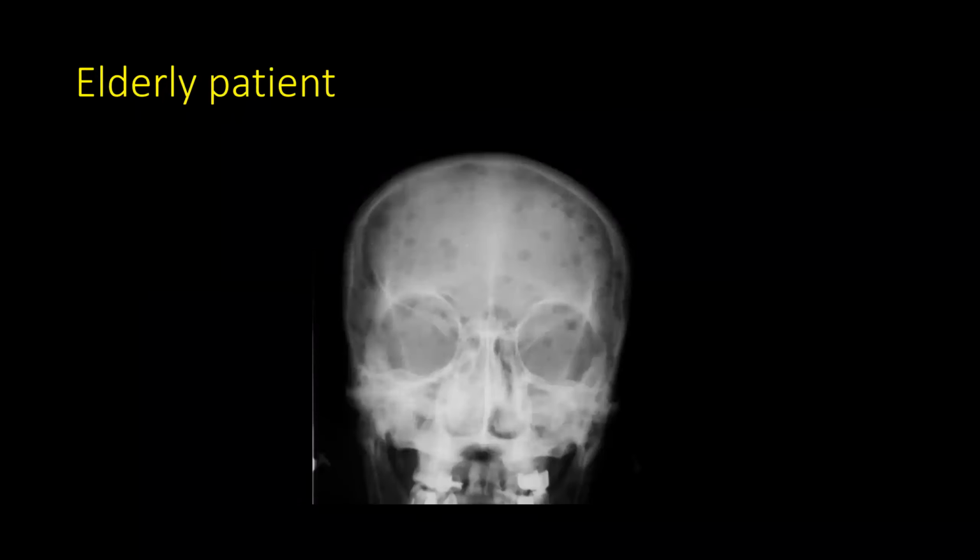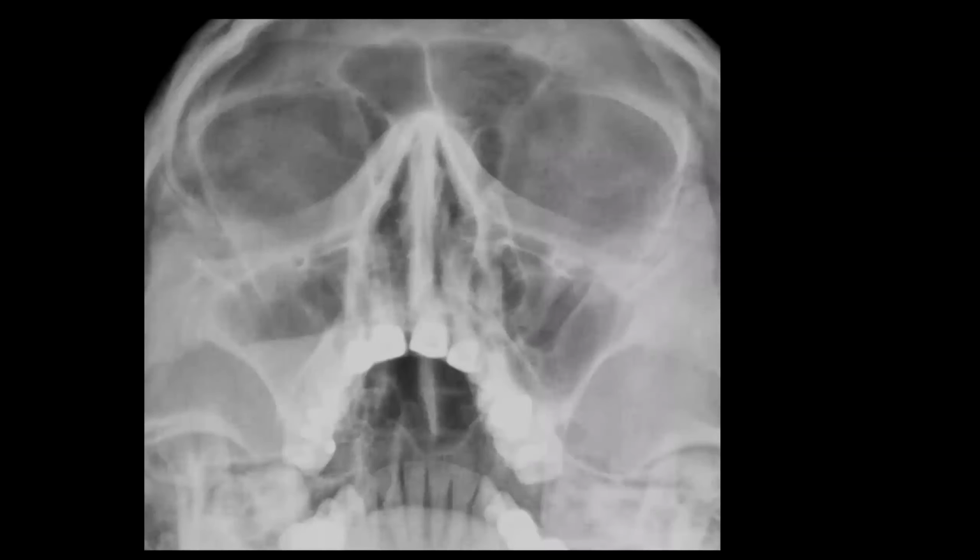It is different in the elderly, whether it is one or there are multiple. So we have to think of other things, like this patient was having multiple myeloma, but let us say this is a female and she is having CA breast. So this will be, yes, metastasis. Okay. Now this patient is also having inferior turbinate enlargement, so she must be having allergic rhinitis also. So quickly revise just a few things.